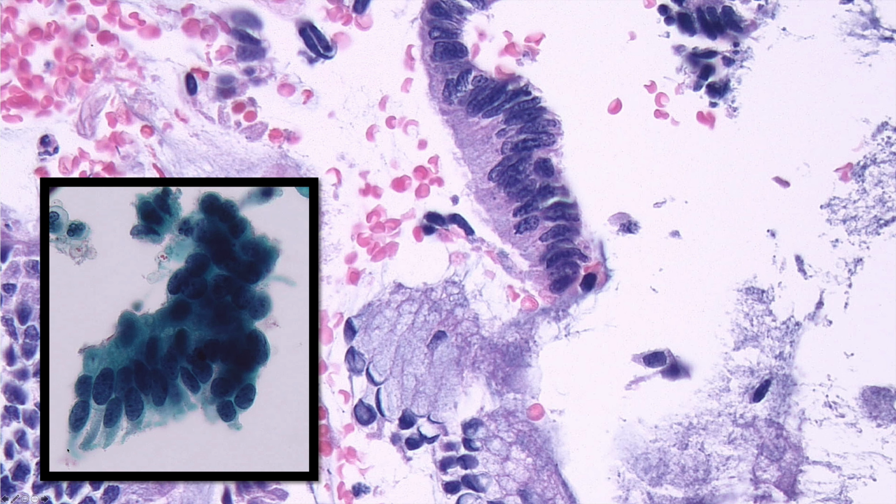This was a specimen which was read as suspicious for AIS, and the patient did end up having AIS. And this is an important image as well, because AIS is not only found in nicely oriented histologic sections, but this was an endocervical curettage, which you can see on the bottom portion of the screen, more normal appearing endocervical glandular cells, and the AIS cells at the top. So these lesions can be somewhat subtle.